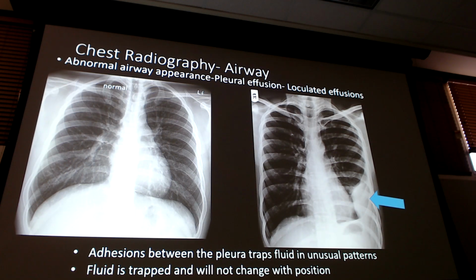Usually what ends up happening is we end up having adhesions in that pleural space. So it's likely adhesed down here. And so that's what's stopping it from going all the way down. And so it's kind of locked into a certain area in the pleura.